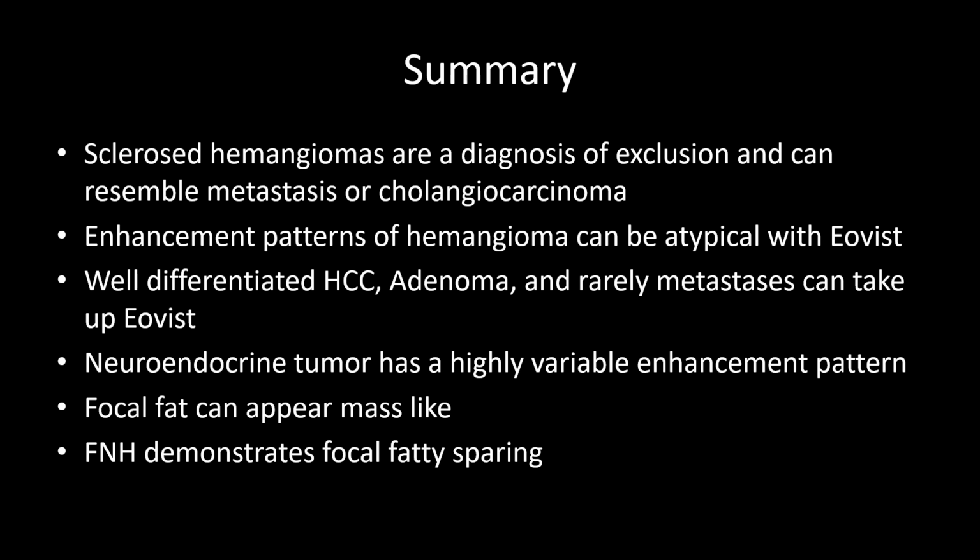Well-differentiated HCC, adenoma, and some rare reports of metastasis have shown Eovist uptake. And before calling a focal nodular hyperplasia, I want you to look back at that T1, look back at that T2, pre-contrast, and make sure whatever you're calling a focal nodular hyperplasia is nearly isointense to the liver. If it is hypo on T1 or hyper on T2, consider some of these alternatives that can take up Eovist.